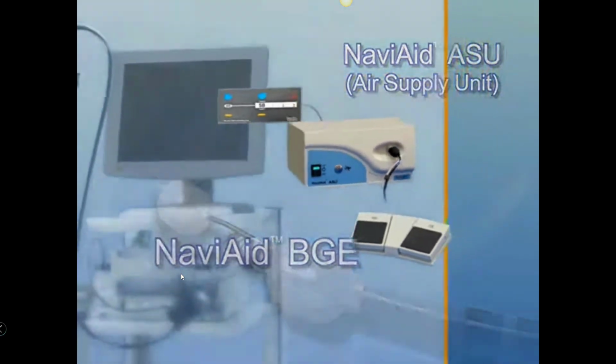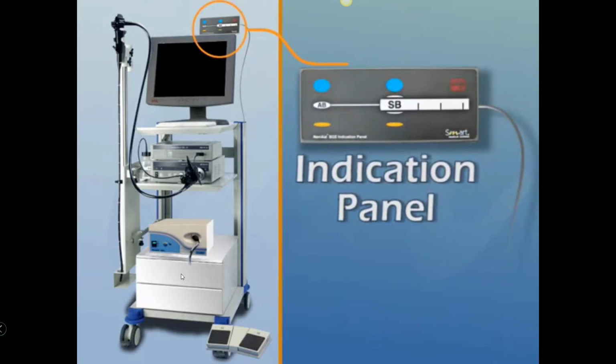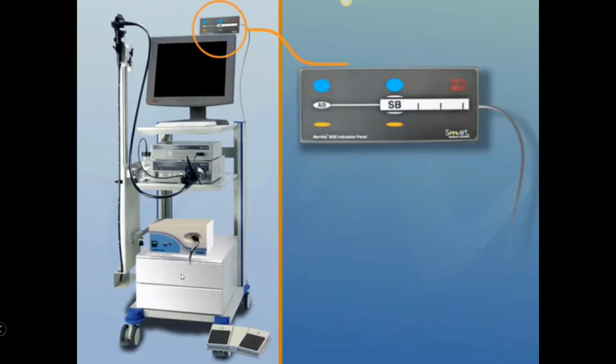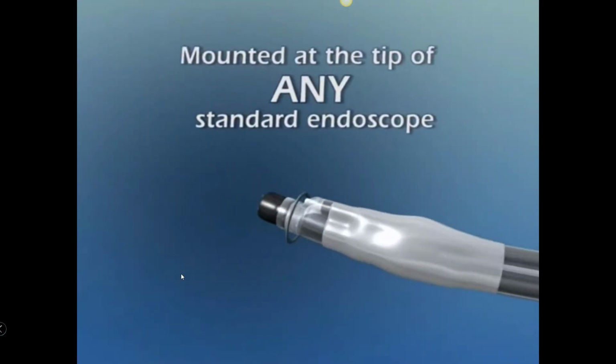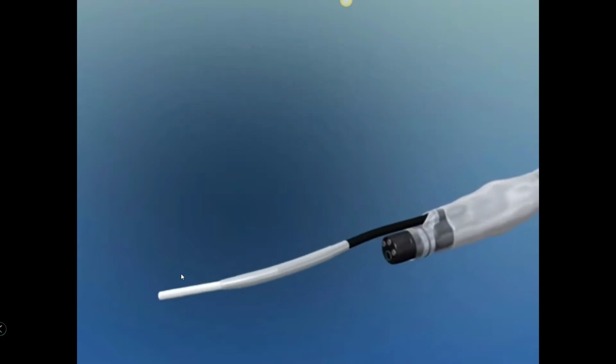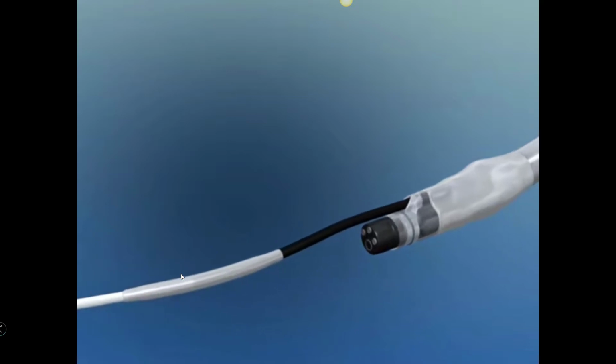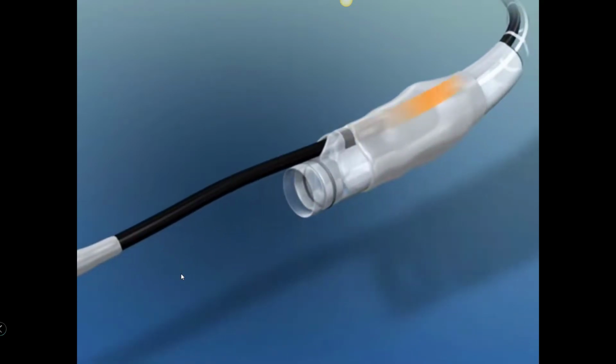The NaviAid air supply unit is placed with any standard endoscopy console, with its indication panel indicating the balloon status located near the monitor. The BGE disposable is easily mounted on the tip of a standard endoscope, with its front balloon sheltered within its rear balloon. The front balloon is advanced or retracted manually. It propagates within a dedicated external channel, leaving the endoscope tool channel free.